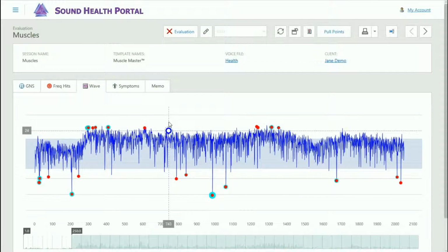There are several ways to zoom in on these. First one is this area down here. You might see in the shadows kind of a pattern. This is reflecting what this wave file looks like. And these flags tell me the range that I'm seeing.